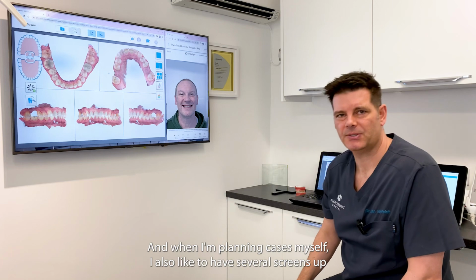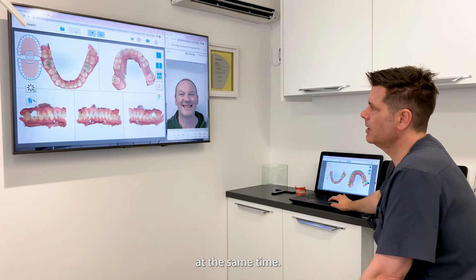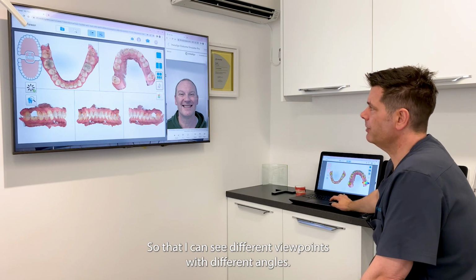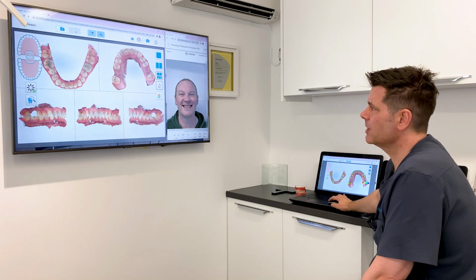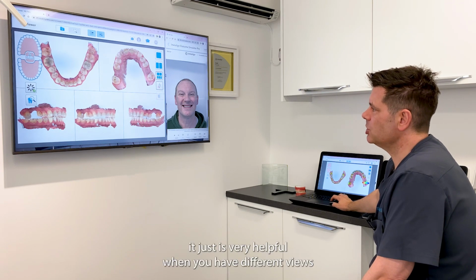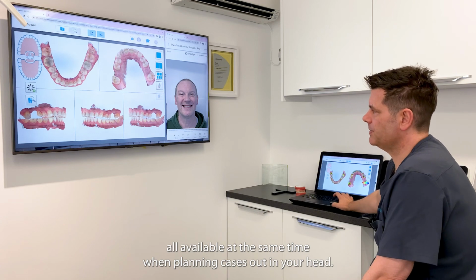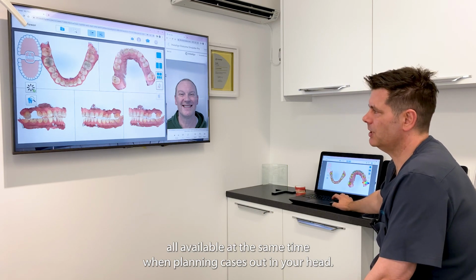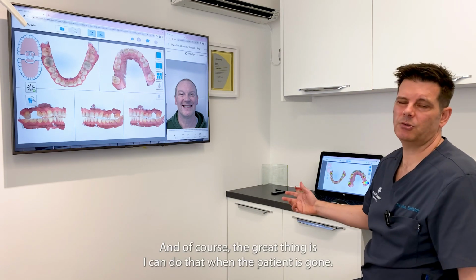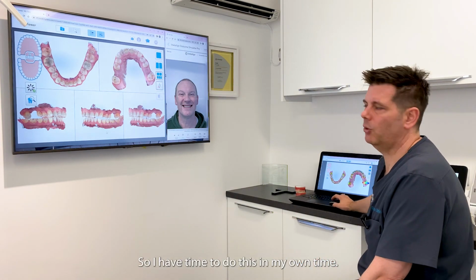And when I'm planning cases myself, I also like to have several screens up at the same time so that I can see different viewpoints with different angles. I might want to see multiple at the same time. It just is very helpful when you have different views all available at the same time when planning cases out in your head. And of course, the great thing is I can do that when the patient is gone, so I have time to do this in my own time.